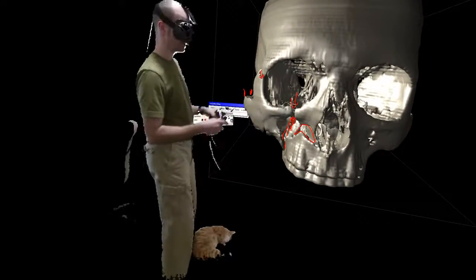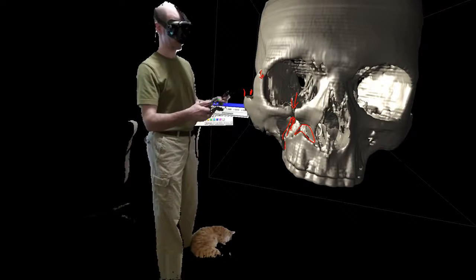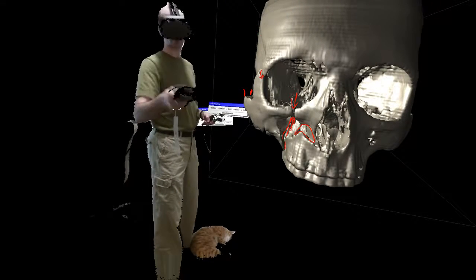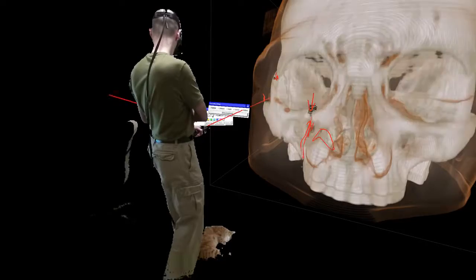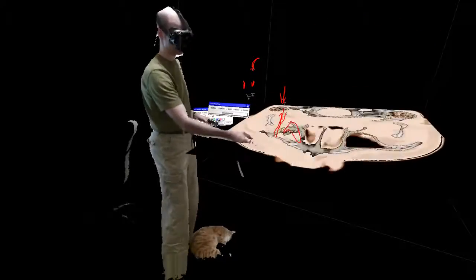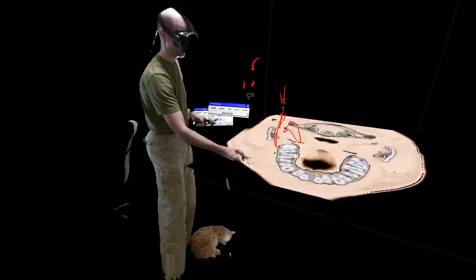So the point being is that when you normally look at CT data like this one, you would be looking at individual slices. We can do that as well. Let me change it over. Slice, and I'm going to make yet another tool. Here we go. And so now let me hide the isosurface for a moment. And then if I hold my hand in there and push a button, I can now create a slice. And at this point, now the slices are more or less aligned with how they were originally collected by the CAT scanner and then stacked back up into a 3D volume.